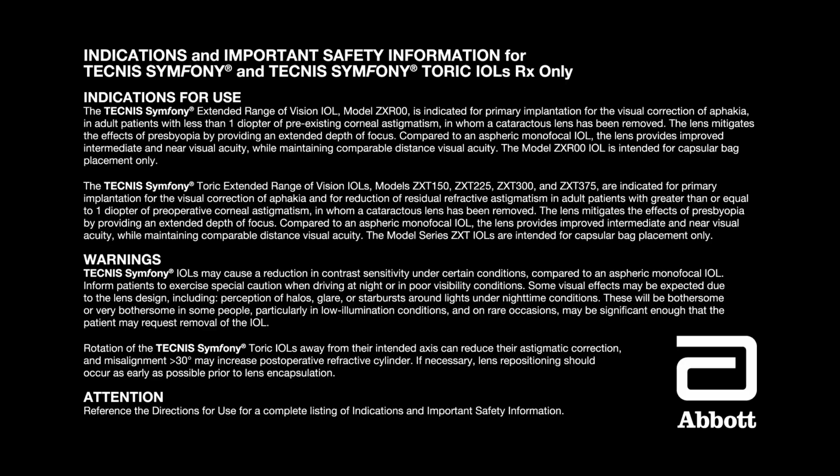The lens mitigates the effects of presbyopia by providing an extended depth of focus. Compared to an aspheric monofocal IOL, the lens provides improved intermediate and near visual acuity while maintaining comparable distance visual acuity. The model ZXR00 IOL is intended for capsular bag placement only.